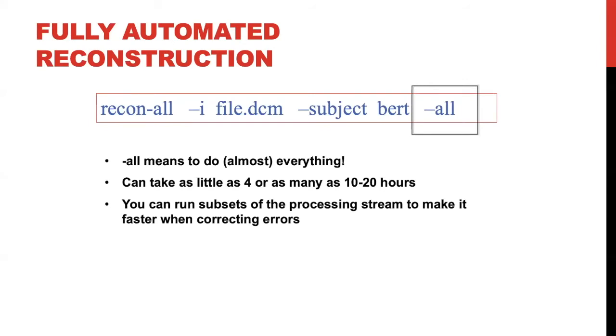And this used to take quite a few hours, 10 to 20 hours to run a couple of subjects, but luckily, as they have come out with different versions of FreeSurfer, we've cut that down, and it can run anywhere from 4 to 8 hours now, which is a lot better than 10 to 20. So that's the command line for FreeSurfer.